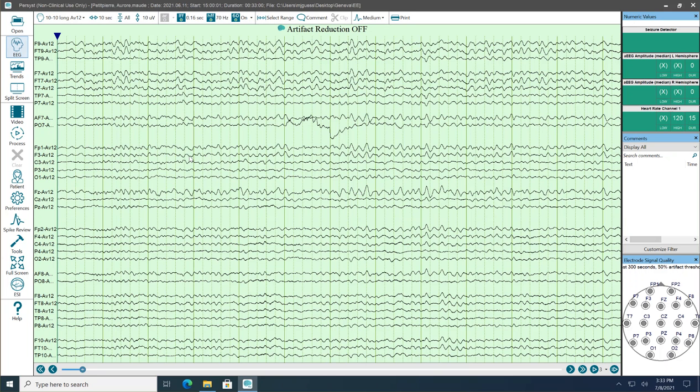All it means is that if a channel exists in a montage, but it's not part of the recording, it won't show it. So this is just to get started again with the 1020 positions and some 1010 subtemporal chains. And now we can go ahead and process.